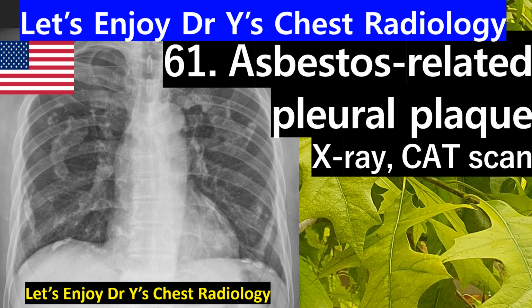Today we're going to talk about asbestos-related pleural plaque X-ray and CAT scan findings. Chapter 61, let's go.